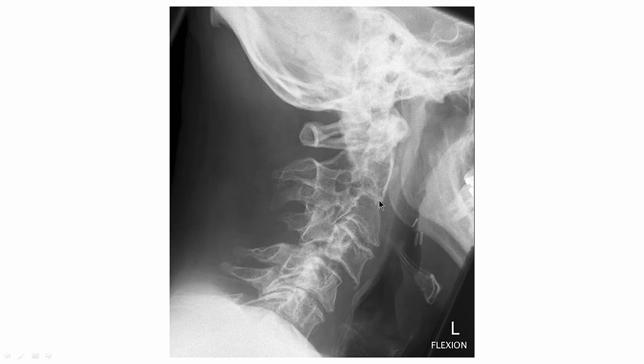Sometimes this happens when you get in my differential diagnosis lumbar spine class. We'll see some examples of how, with severe degeneration, the bones can actually fuse together. But this is something the patient was born with. These two bones have just grown together. It still has a neuroforamina you can see here. So that's a congenital block of C2 and C3. Okay, there's the spinal laminar line there I drew for you. All right, that's enough with that here.